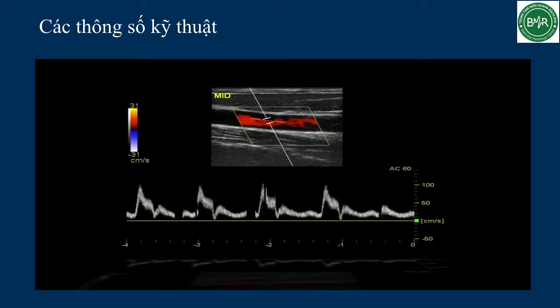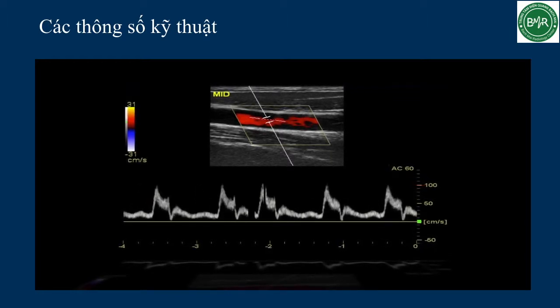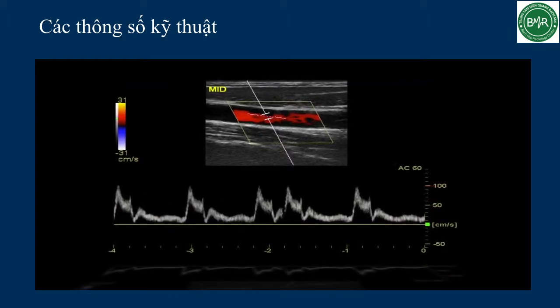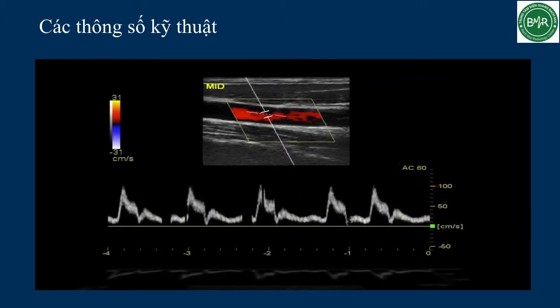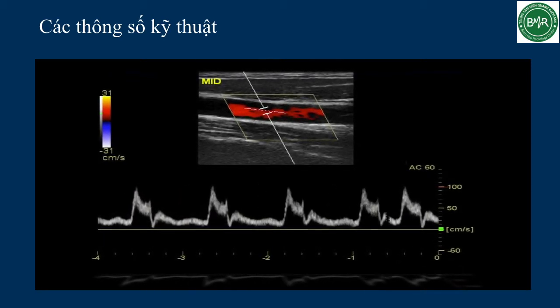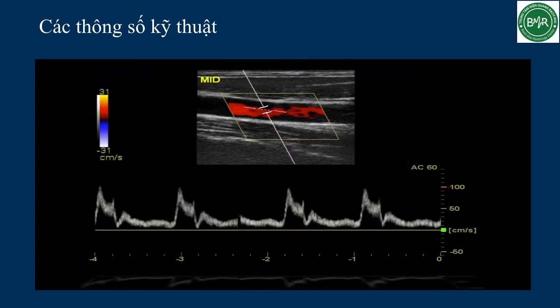Activate the spectral Doppler display mode. The spectral Doppler waveform enables the user to graphically visualize the velocity of blood flow over time. The system is dependent upon the user to set a number of parameters so that the correct result is displayed.